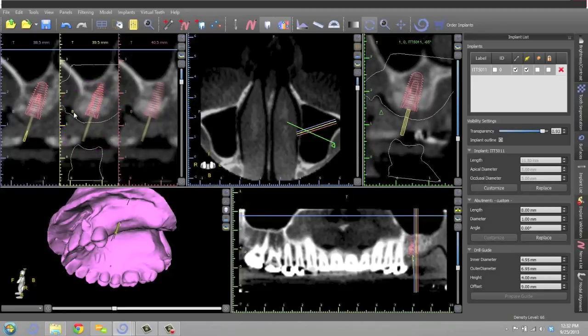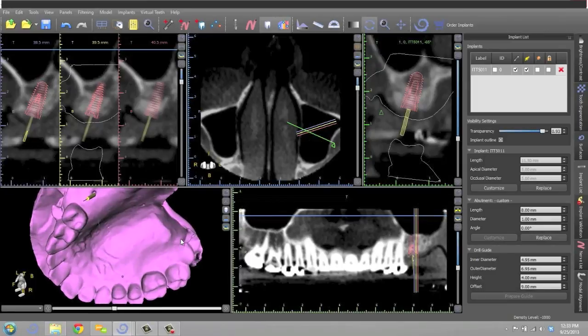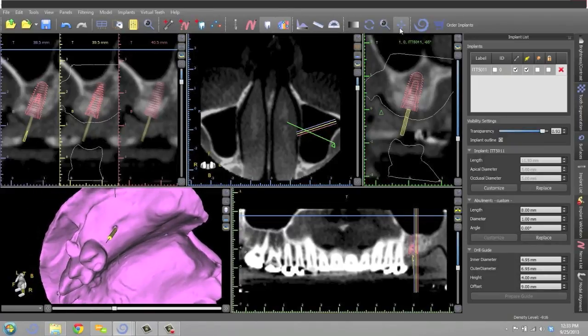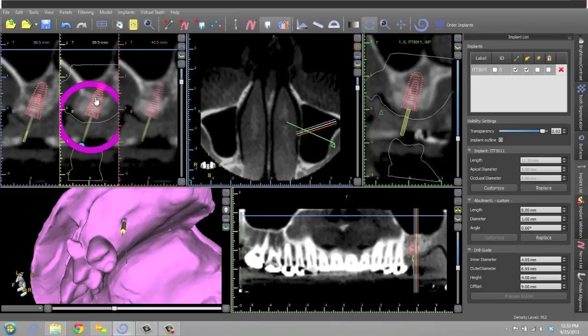It's hard to discern the apex of a wide ridge like this. And that's why the divot comes in really handy. So now, this is a scroll function right here. And watch this area here as I'm working the cross section.